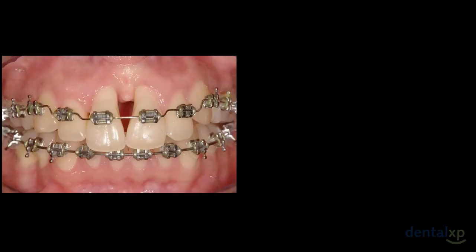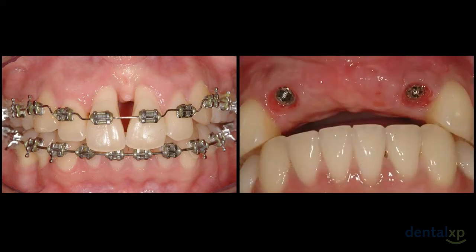Because when patients present to you such as this patient referred for 2 implants in the central incisors, a traditional surgical template was created. Communication with the surgical colleague was used so that we have a defined treatment plan. What went wrong when the patient returns after implant placement, such as this? Where did the miscommunication between the surgical colleagues and the restorative colleagues come into play?